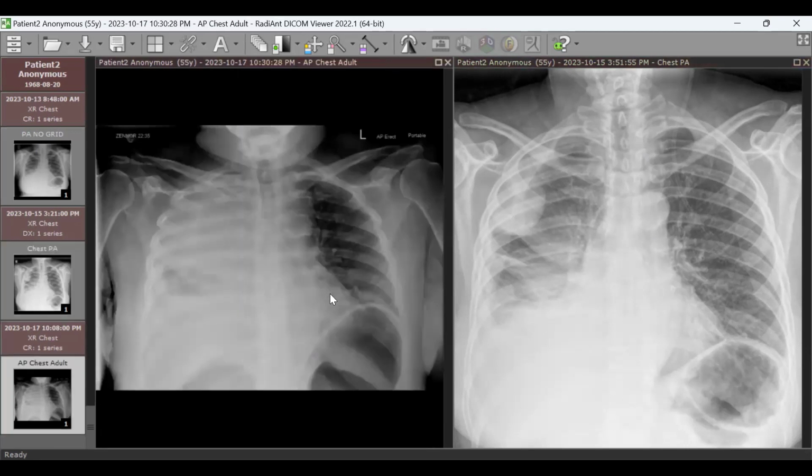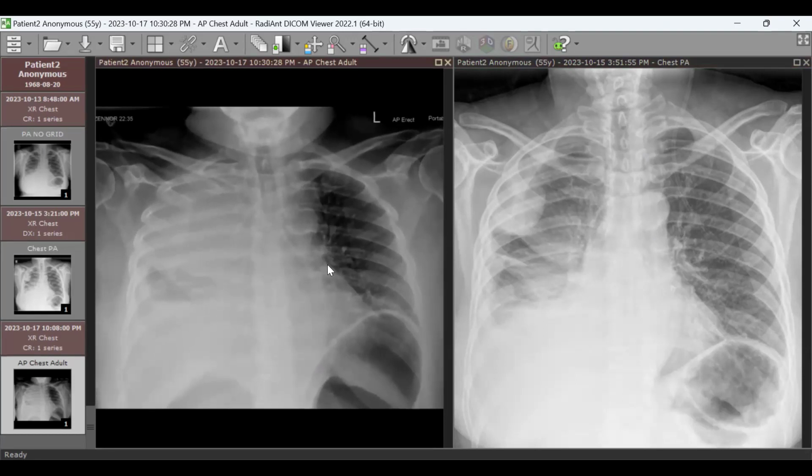And this third one is also 2 days after the second one. So what happened in this short interval? There's an abnormal line, but don't worry about it.